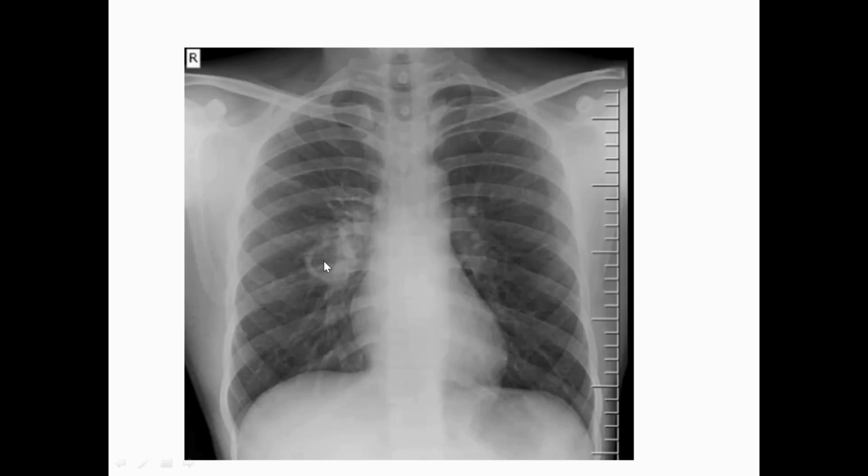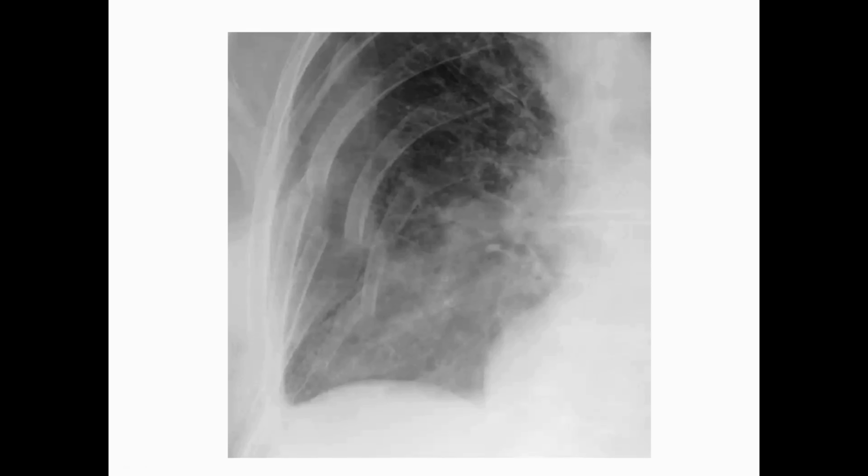The cavity is usually a gas-filled space within the lung parenchyma. A cavity is usually formed by necrosis of the lung tissue. So if you see a cavity, usually the features suggest maybe abscess, malignancy, or fungal infection. These patients need to be further investigated with a CT scan, to exclude lung malignancy, but it could be an abscess also, or fungal infection.